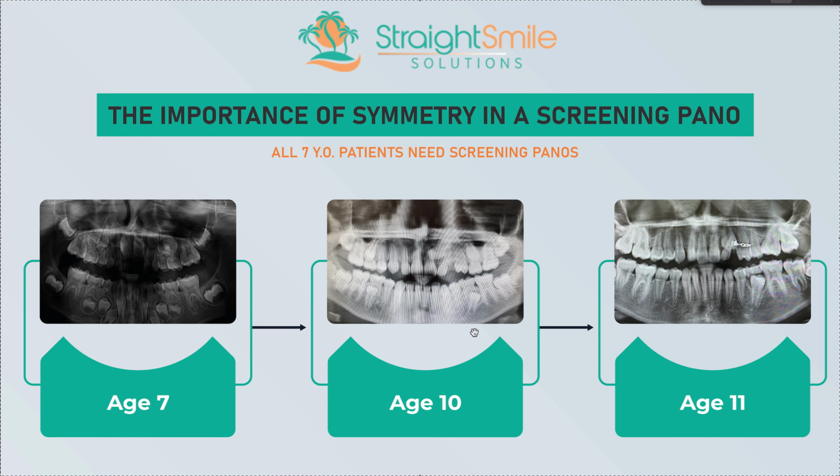And then there's our friend on the bottom. Look at him. Remember, I said that something might be up with that? Well, look at that. That one's vertical. That one's not. And still a problem at age 11, right? I think eventually that did come out. And we did do an exposure. It was so palatal, like way in the middle of the mouth, that we were able to do the exposure actually with Invisalign, which, I don't recommend that, by the way, and buttons. I would never do that again.